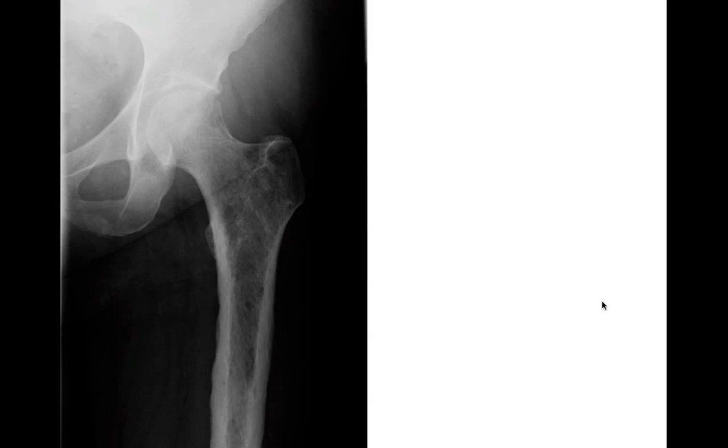All right, radiograph of the femur. Here we have all these lytic areas in the proximal femur. So this is an infiltrating lesion. I would call this a permeative lesion, a diffusely permeative lesion of the proximal femur. So remember, we're going to think of nasty things in this case. So mets and myeloma, I certainly think, are going to be the top two. Could this be an aggressive infection? Sure. I really wouldn't include much else in the differential in this case. Mets and myeloma are going to be the top. This turned out to be metastatic breast cancer in this case. Multiple myeloma would look identical.